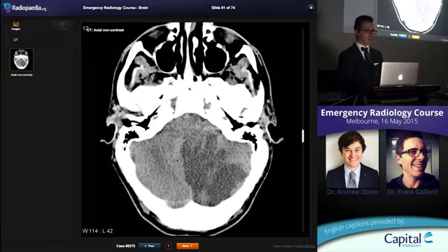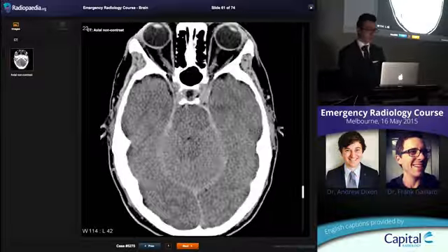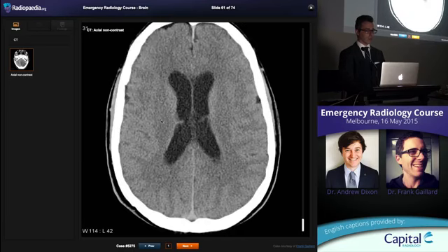And here's the patient with posterior inferior cerebellar artery territory infarct. We know this is established, 12 hours old at least. It's probably older than that because there's a lot of swelling. And you can tell that because there's no CSF left in front of the pons. That's the basilar artery squashed up against the clivus. And this too is a medical emergency. We can see they have hydrocephalus. Look at the size of those temporal horns and how little CSF there is surrounding that.